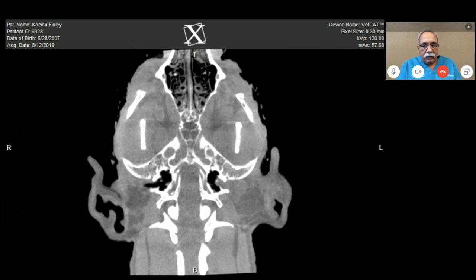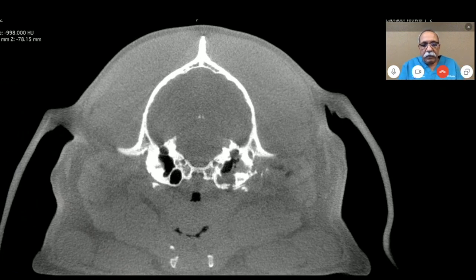So the next one is a very typical image of a cholesteatoma. Cholesteatoma is a growth that starts from the skin, penetrates into the eardrum, and the skin keeps growing in the middle ear. Right where it is showing, you can see the bone. Bony destruction is a characteristic of cholesteatoma. There is a lot of bony lysis going on. Bone gets very destroyed from the osteolytic chemicals from cholesteatoma.